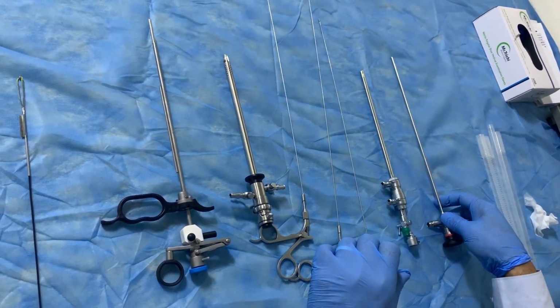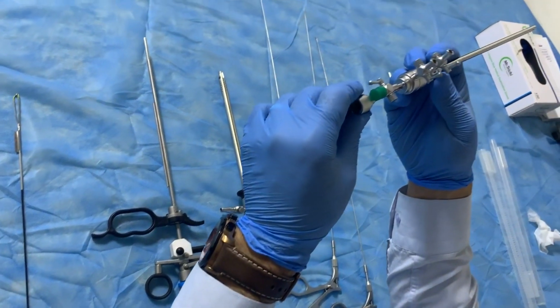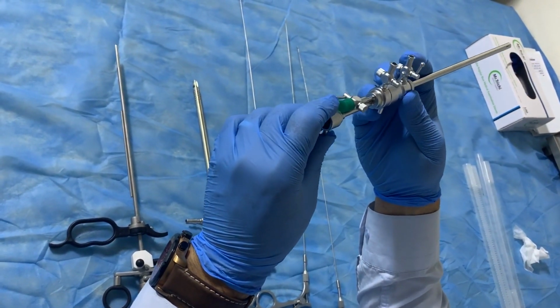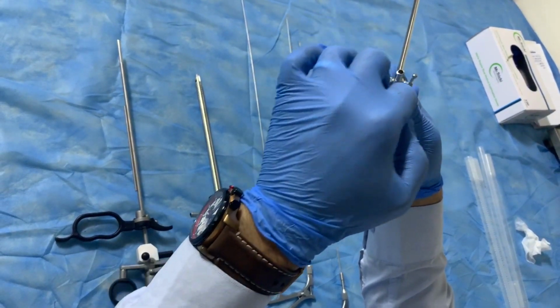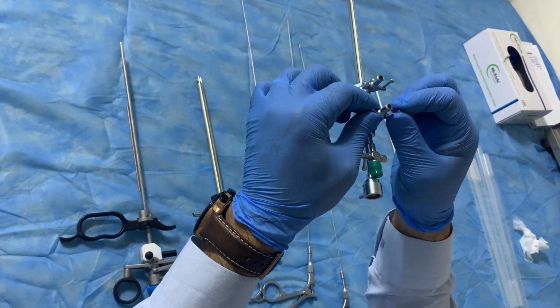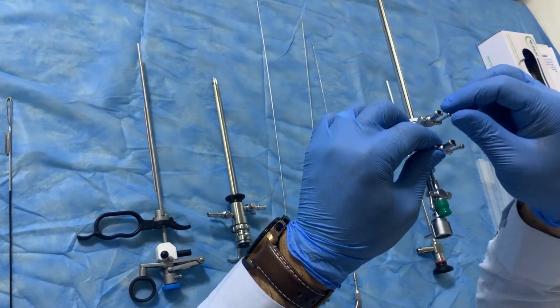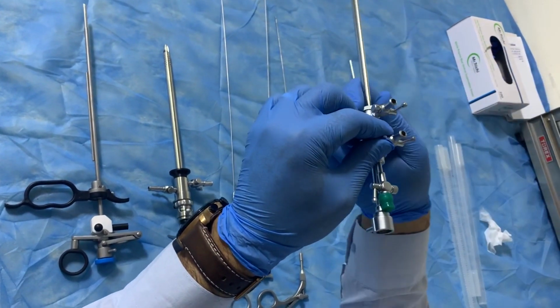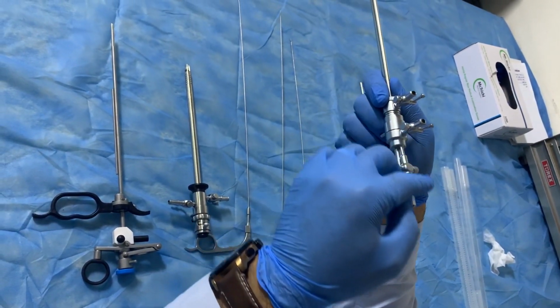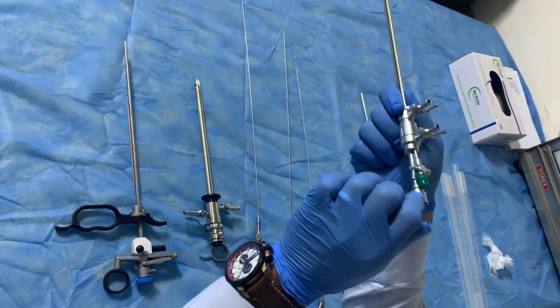Another part of the hysteroscope is called the therapeutic hysteroscope. It contains multiple channels and 2 ports. One port is for input. Beside me, this is for input of fluid. And far away from me is the exit of fluid. Don't forget, beside me is for input of fluid, and far away is for exit of fluid.